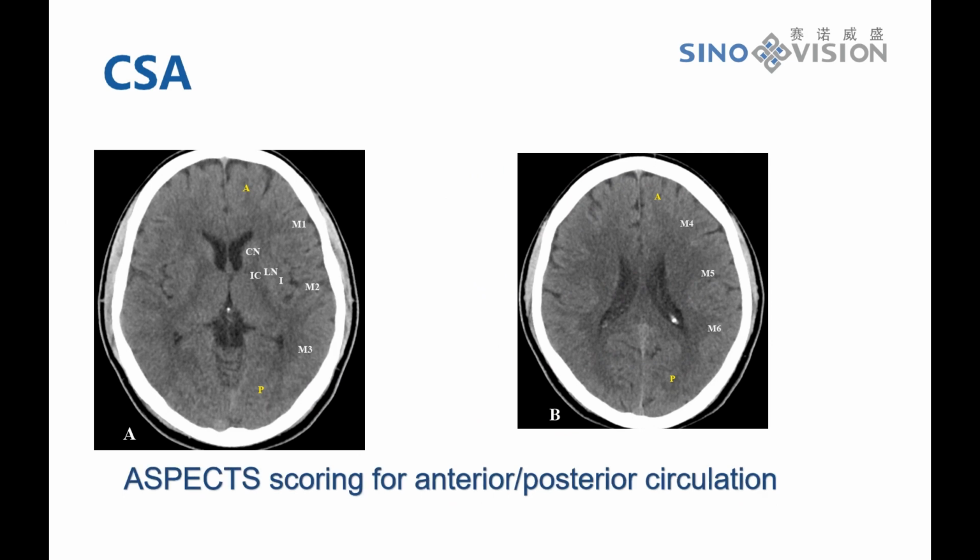Cerebral infarction analysis enables ASPECTS scoring for anterior or posterior circulation and performs quantitative analysis of parameters on ischemic tissue.